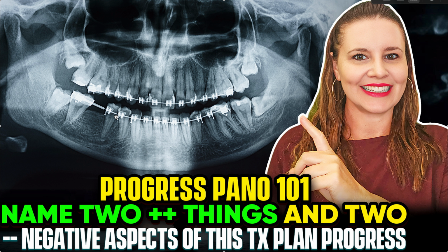And I'd also say not touching this until not only wisdom teeth come out, but perio checks this defect that is likely going to happen after that wisdom tooth comes out. So, okay, we got that.